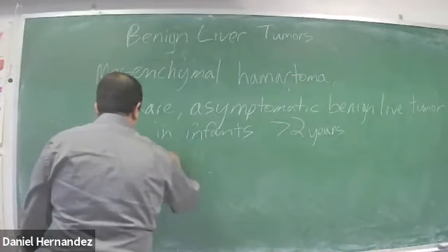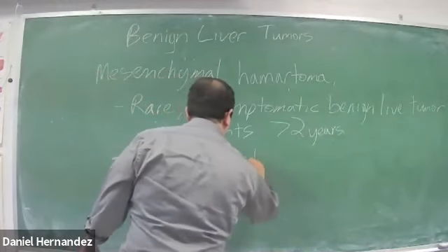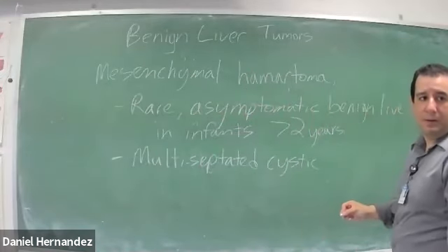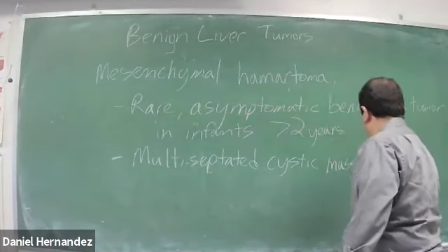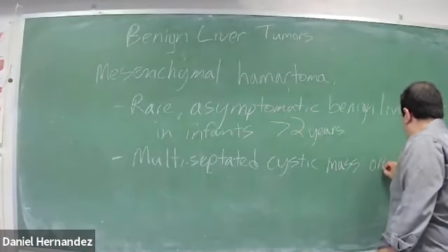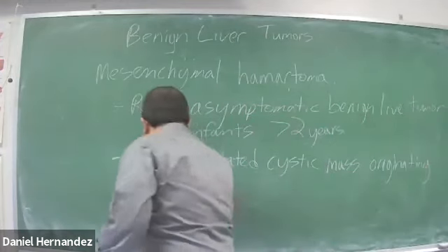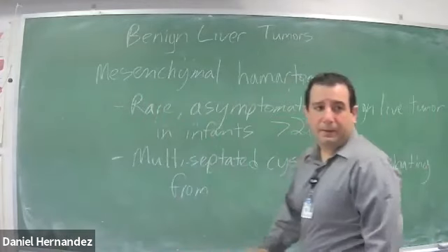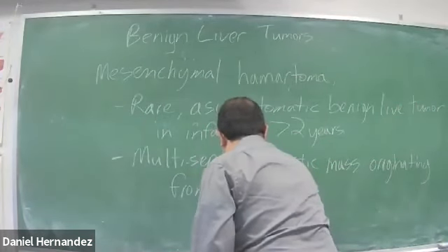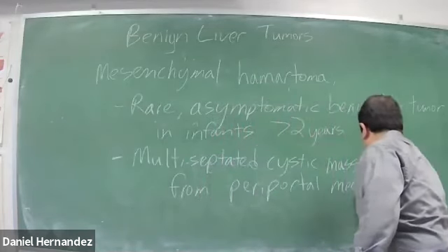It's a multi-septated cystic mass originating from periportal mesenchyme.